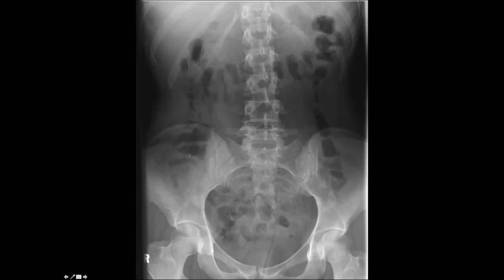We have got an abdominal X-ray. Any additional opacities here? We cannot see anything additional. So let me just move the mouse. That's bowel gas, B for bowel gas. This is the peripheral bowel gas. If you look from your anatomy, you would know it's peripheral, looks like large bowel. So ascending colon, hepatic flexure, transverse, splenic, and then descending colon.